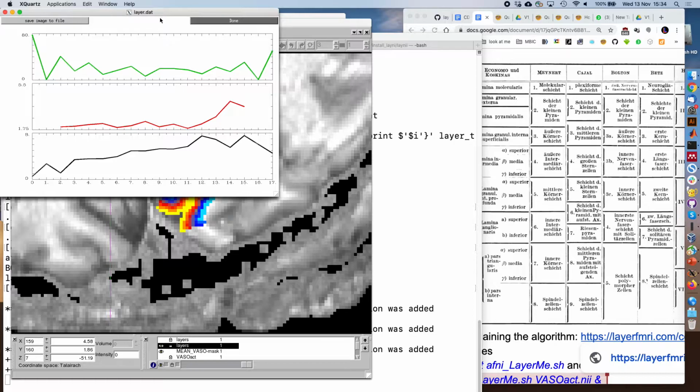The second line is the standard deviation, which is very characteristic for BOLD: it's flat within gray matter, and then we have this L shape where towards CSF it really shoots up. This is mostly physiological noise of the large pial veins at the superficial layers. The bottom row is the mean value of the BOLD signal change in each layer. And you see it's a linear trend. The superficial layers have a larger BOLD signal change than the deeper ones.